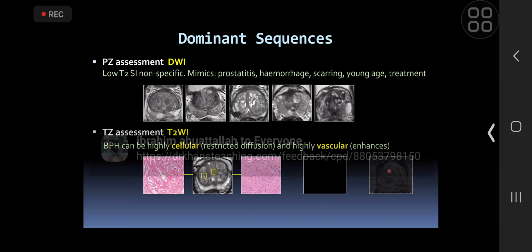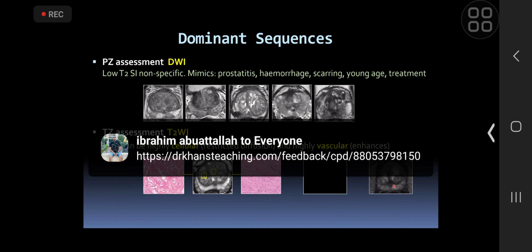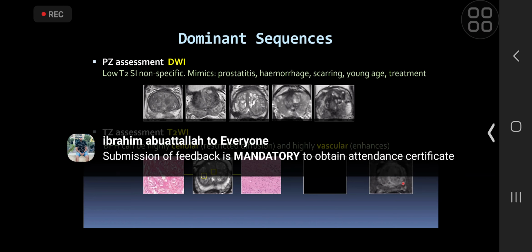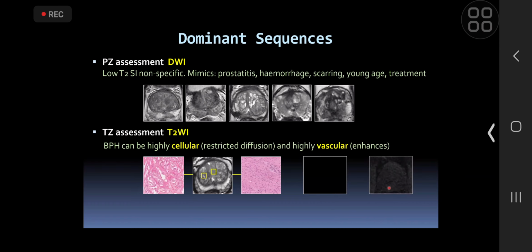This is just an example of some prostatitis. So if you look at the peripheral zone there, there's diffuse hyperenhancement within the peripheral zone, matching the transition zone, actually washing out as well by this later stage. You'll see as that video comes around again. Now that isn't positive on DCE because it doesn't fulfill those 3 criteria that we talked about. So as the video goes around again, if you keep an eye on that peripheral zone, you'll see there'll be marked early enhancement. Sorry, let's just go back and play that. So you'll see here where I'm highlighting marked early enhancement within the peripheral zone, matching that transition zone enhancement.